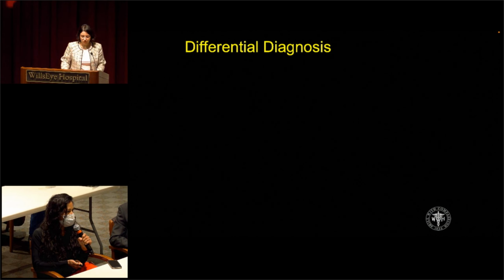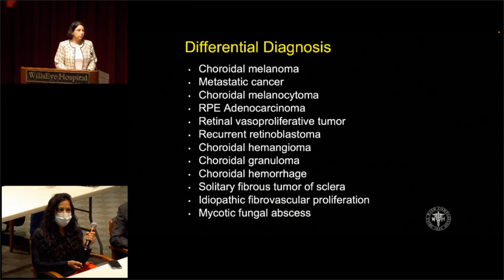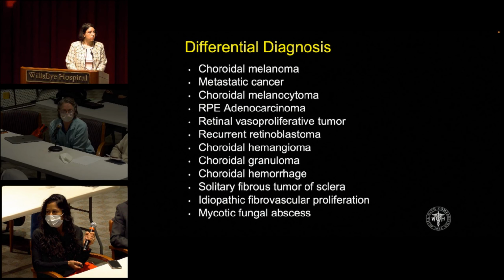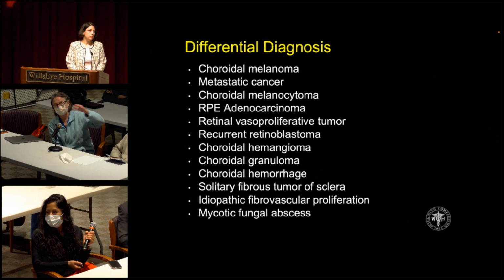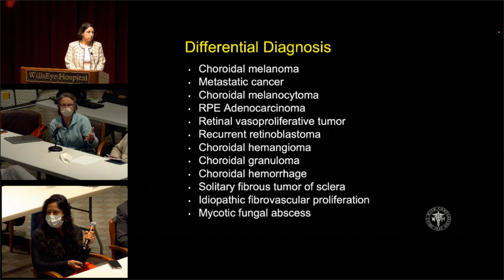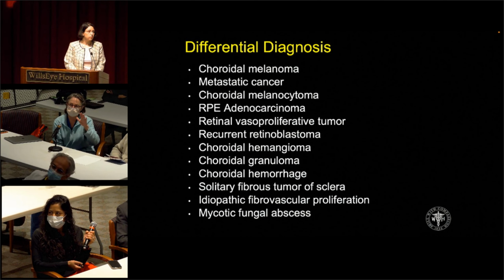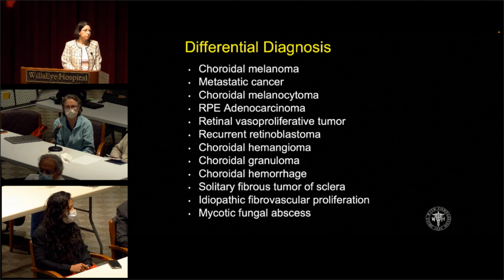I agree with all those. The only other thing I would add would be peripheral exudative hemorrhagic chorioretinopathy, a form of extramacular degeneration with giant PEDs. We see the most giant PEDs in oncology because they're referred in as melanoma, but they're dome-shaped, not mushroom-shaped, and they're hemorrhagic, in older patients, and tend to be bilateral. We saw on your OCT and your excellent fluorescein no abnormality in the other eye. So that puts that lower on our list, but keep that in mind.